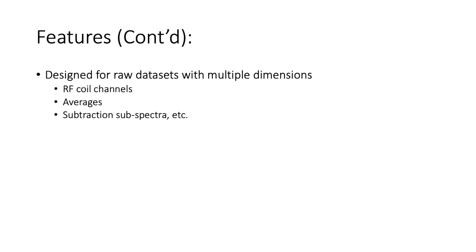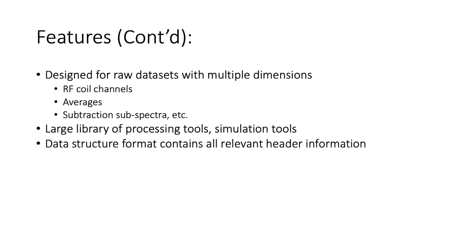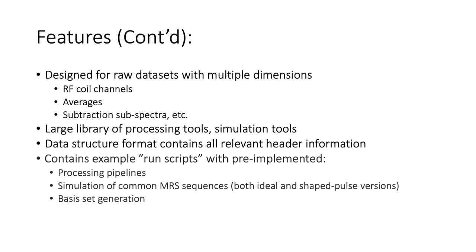So FID-A is designed specifically to handle this type of multidimensional data and to manage these dimensions and be able to manipulate them. It has a large library of processing tools and simulation tools, and the data are stored in a structure format that contains not only the data itself in both the time domain and frequency domain, but also all relevant header information.